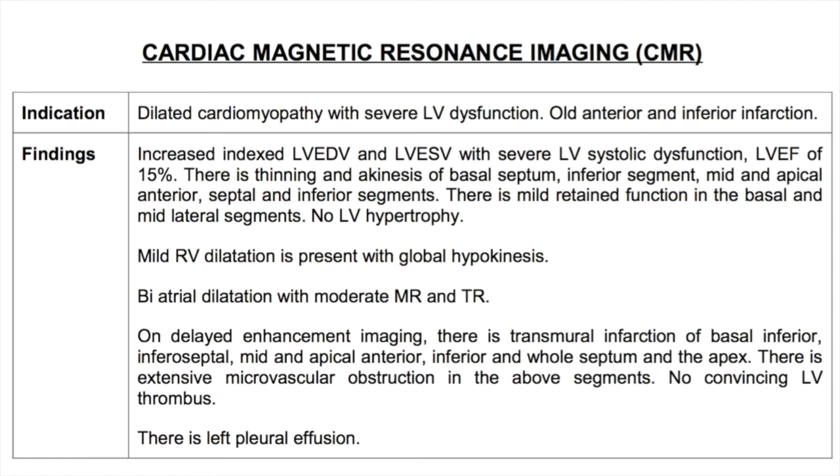Let us look at some of our sample reports. So, this is a patient with dilated cardiomyopathy and severe LV dysfunction with prior infarction, and the reason this patient was referred to us was for viability assessment.